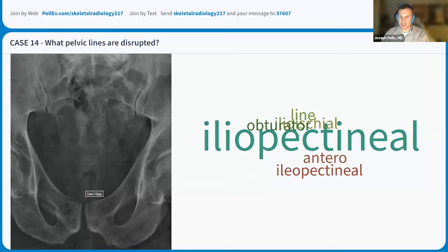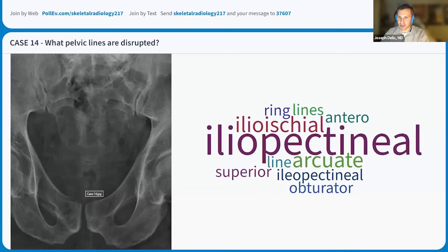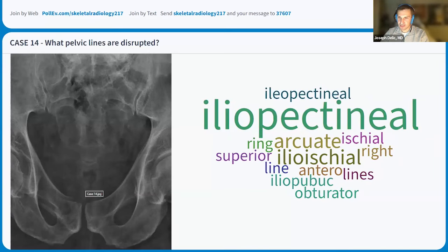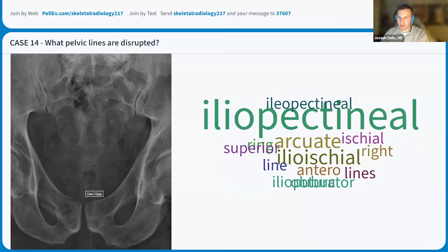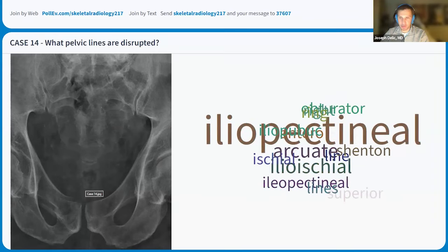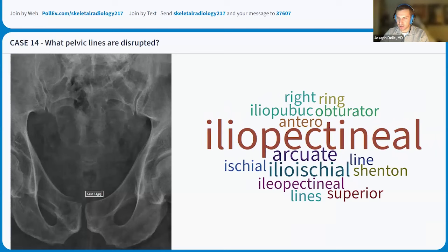Okay, good. I like these ones because we get to see a variety of answers. So we got a lot of good answers. I like iliopectineal. I like ilioischial. And there's a smaller one in there, but I like that one as well. I like the arcuate lines.